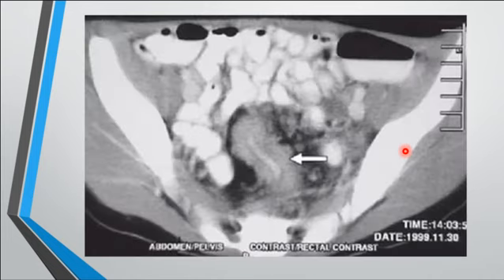Now, what's going on here? Part 1, girls. Yalla. We are just having fun here. Describe what you see.